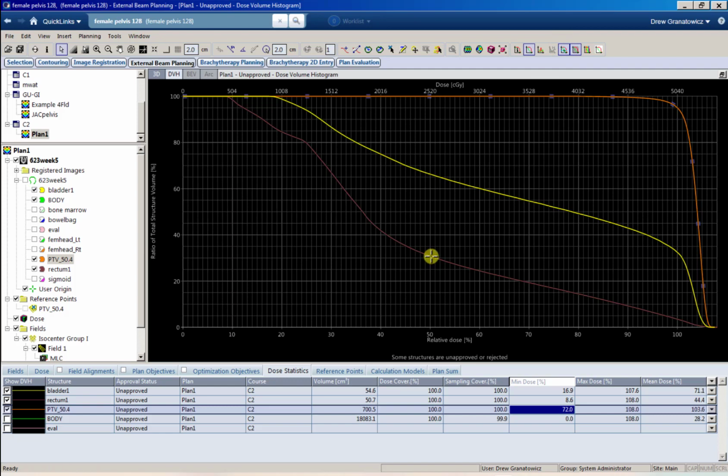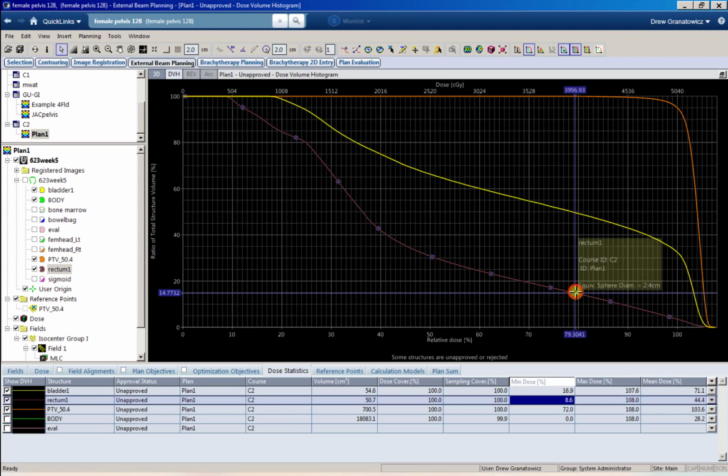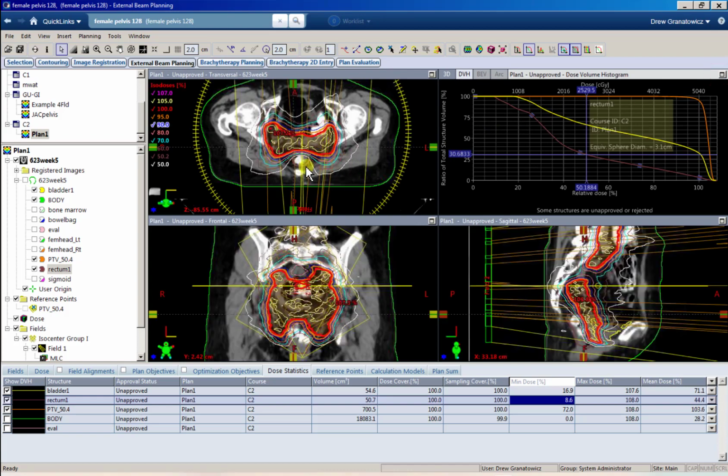So we were looking at 25/20, so 50% of our dose. We were trying to get that under 30. Oh, we're so close. So close. So I might even try to run this another time to get that 0.7% lower. And then we were looking at 4,000. About right there, under 15, and that did come down. So I was pretty confident about this one. I was not so sure about this one, but we got really, really close. So it might definitely be possible.